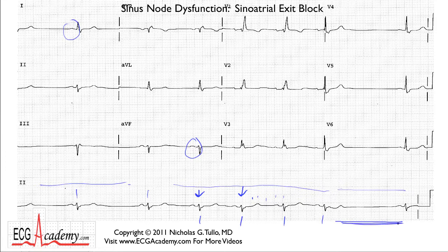Now this is the important part. If you take a pair of calipers, and you can move these around here, let's take the P waves and measure the P wave intervals. Remember, try to do the beginning of the P wave because sometimes the top part may be arbitrary. So you have a pretty regular rhythm that's going on here. And as I said, if you pick up the calipers and put it on a heavy line, you can count off a little bit less than 60 beats per minute.